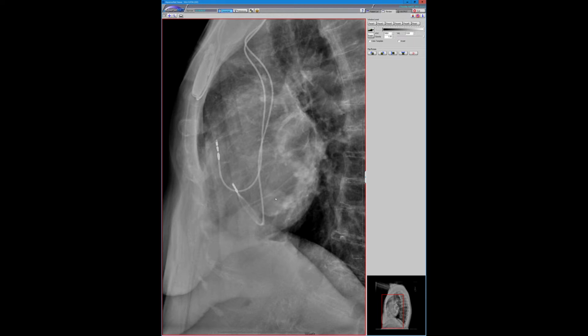And we've seen cases, people have shown cases here where it extends into the myocardium. Once or twice a year, people show a nice case of that. So this was just a nice example of caseous MAC that on MR threw me for a loop for about 10 minutes until I recognized it on the scouts and kind of just thinking about it.